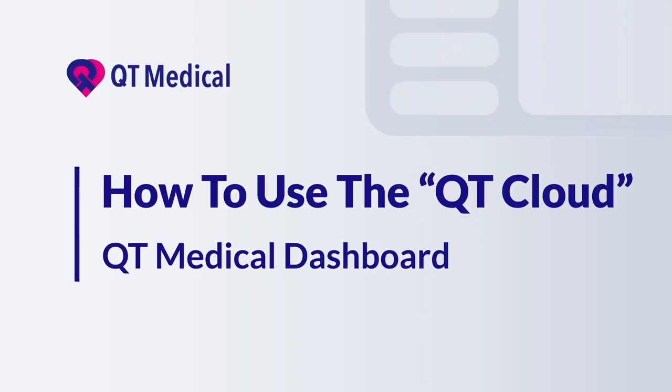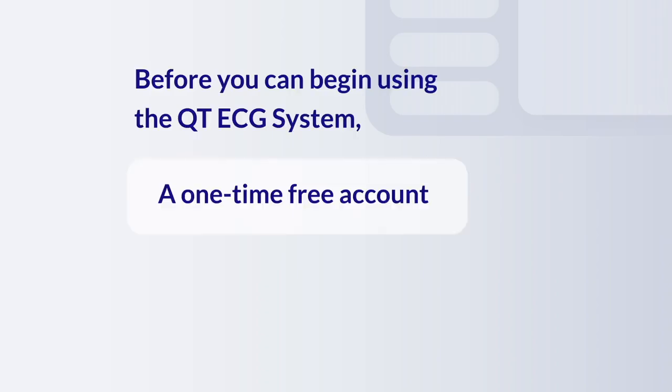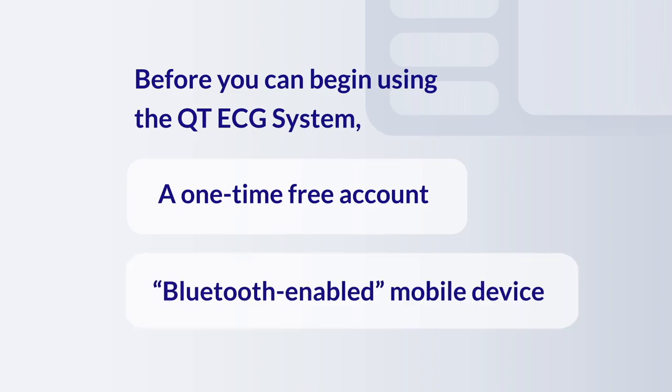How to use the QT Cloud QT Medical Dashboard. Step 1. Registration. Before you can begin using the QT ECG system, a one-time free account setup is required. Please have your Bluetooth-enabled mobile device ready.